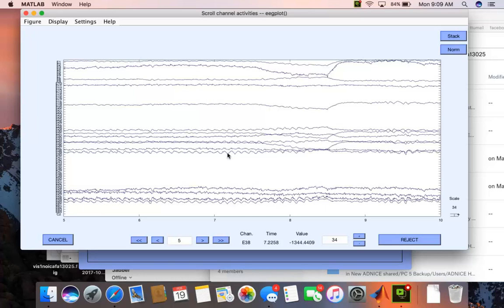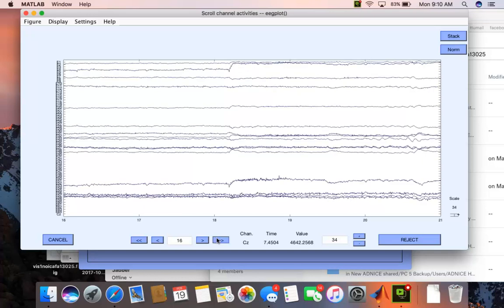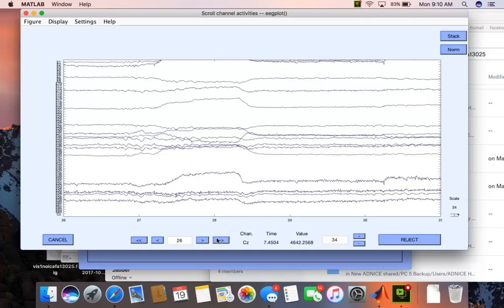That's because we haven't filtered out any DC offset or done any low pass filtering. By the way, the horizontal axis is time, displayed in seconds, and I'm using some special EEG software that allows me to display this relatively easily. You can see that at 8.5 seconds, we have some kind of major movement, and lots of just junk in the signal. Lots of stuff going on here that is not EEG.